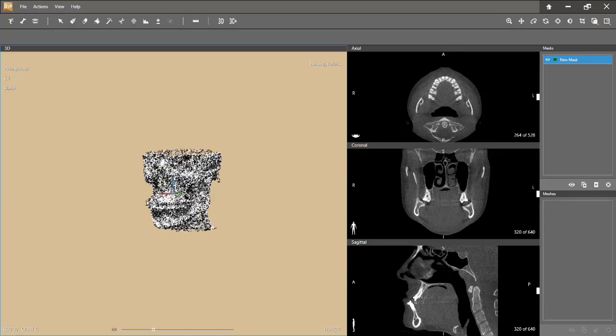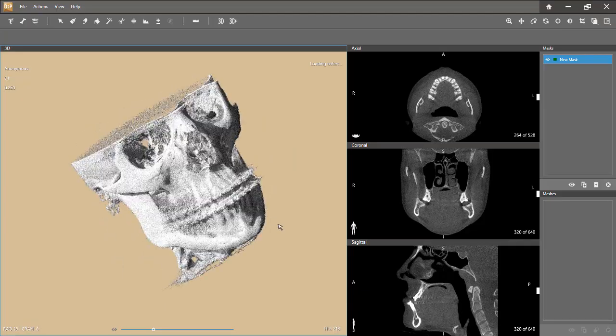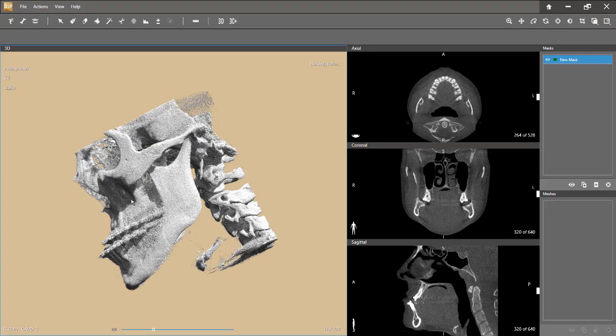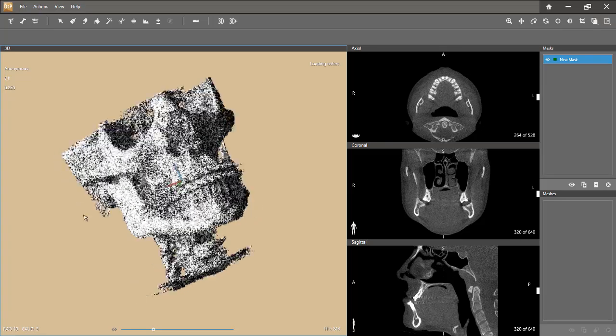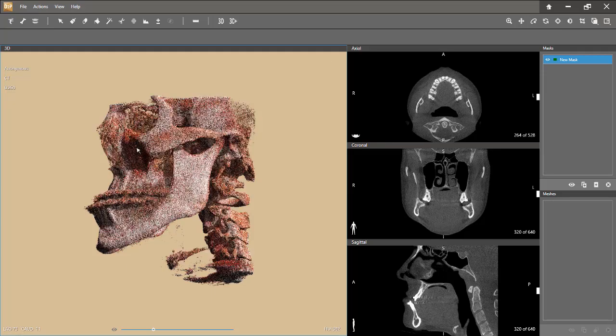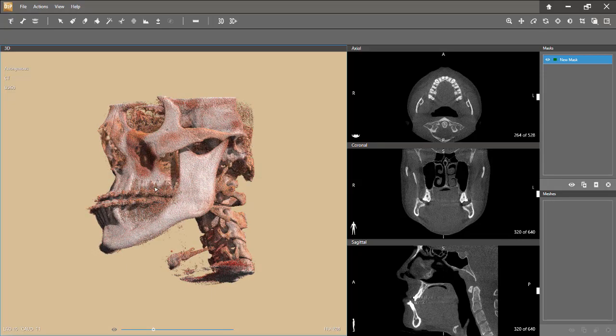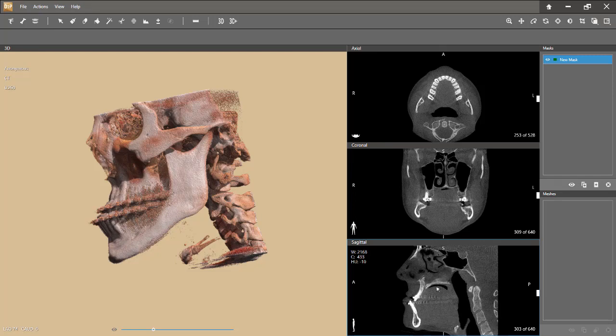And now I have my 3D view. Everything is calculated from the slides, and Dicom to Print, D2P, is rebuilding the 3D view based on that. D2P is a medical device. It's not a general software. It means I don't have a front view or side view. I have my 3D view and my axial view. I can navigate with the wheel. My coronal view, so from front, anterior, to posterior, and my sagittal view, from left to right.